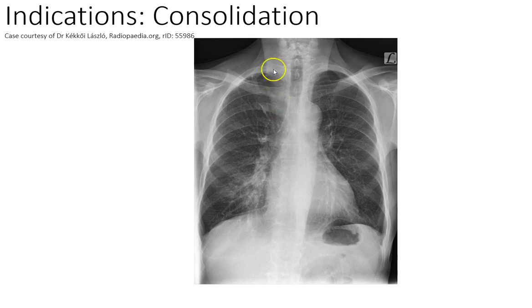So perhaps there's something brewing up here. Looking down, this is increased lung markings, and these increased lung markings indicate consolidation. That in conjunction with this could be called an air bronchogram, when you can follow the trachea further than the bifurcation to the two main bronchi. That's an air bronchogram, and those might make me think that there's some lung pathology, perhaps some consolidation.